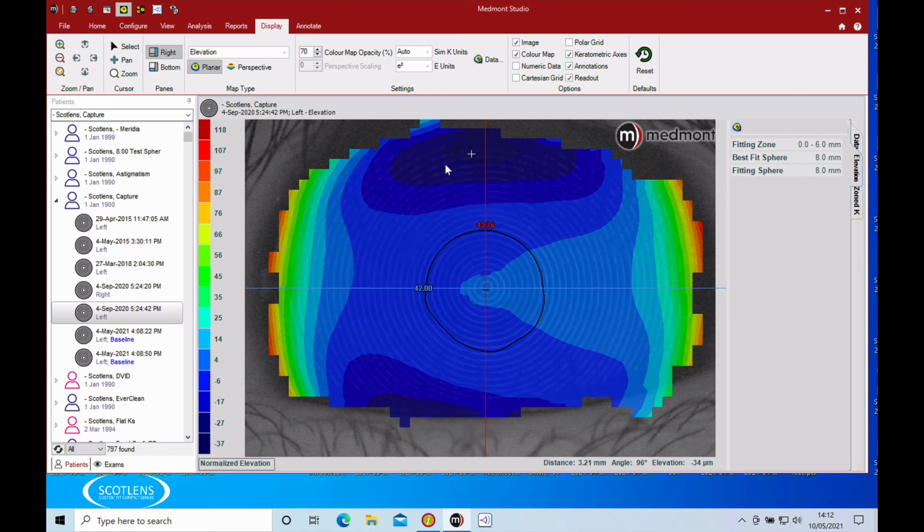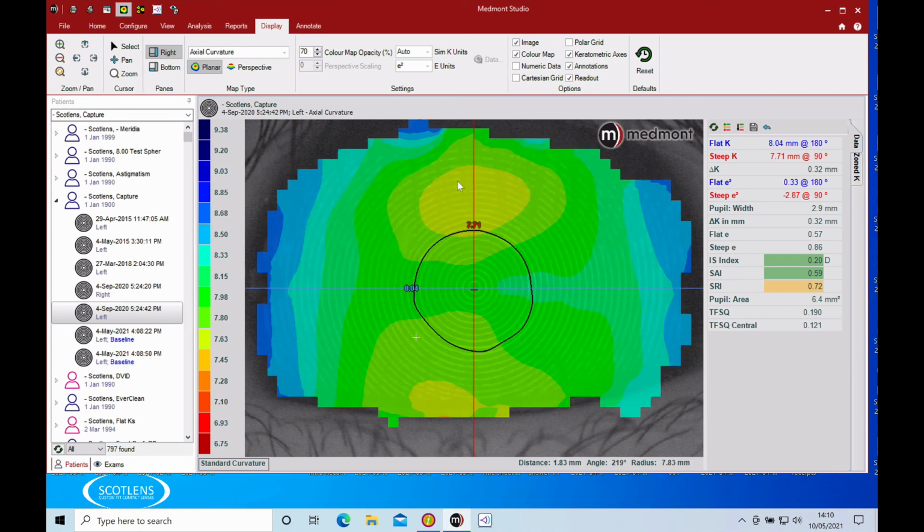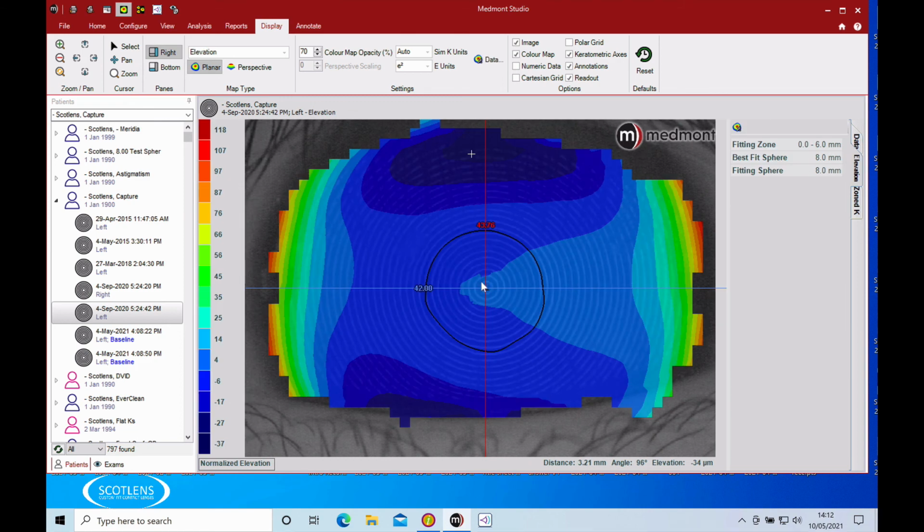Of course, the fluorescein on the cornea doesn't represent lid interaction, and there's downsides to it, but it's the way that gas perm lenses are designed on the topography map. So that's tangential, this pinpoint map, axial and refractive, where they have this mathematical sphere on them, assuming that the cornea is a lens. And then we've got basically the elevation map is the one that's got any relevance from the height, the actual three-dimensional hill of the shape of the cornea in relation to a lens or what we're going to fit with it.